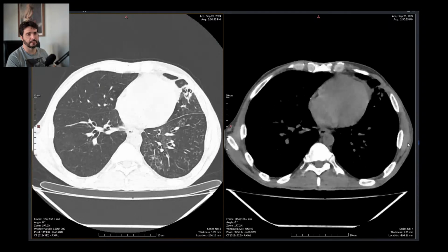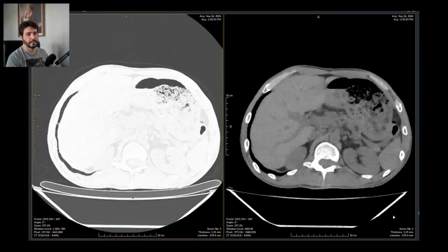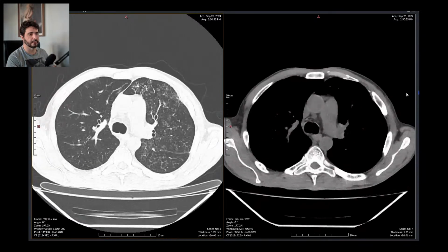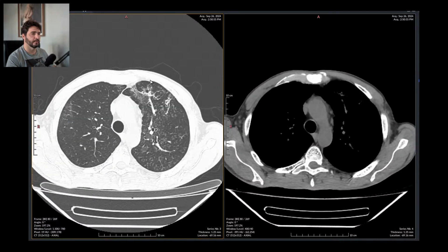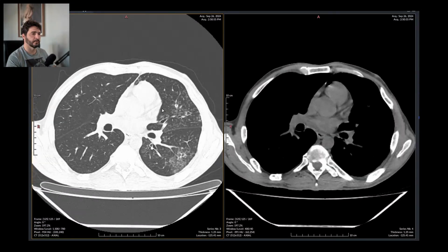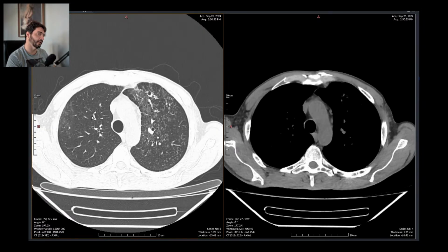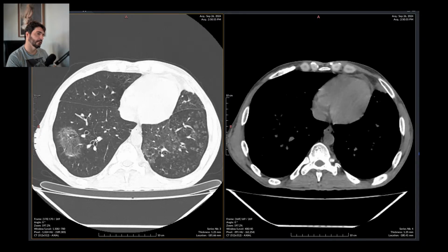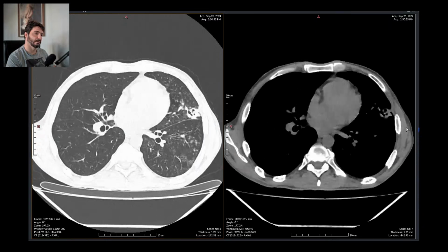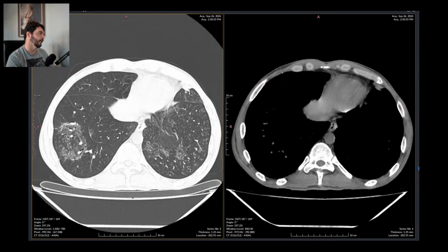Considering we are in Brazil, this is most probably a case of post-primary tuberculosis: bronchiectasis, small consolidations, pulmonary bands, micronodules with tree in bud morphology, much more prominent on the upper lobes, and the patient has been losing weight.